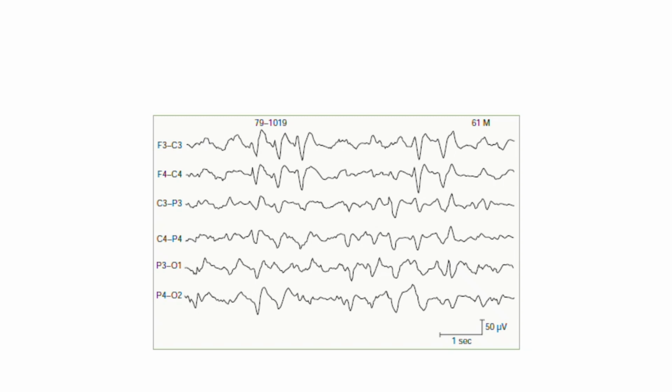3. Pathophysiology. The rhythmicity, synchrony, and front-to-back migration of triphasic waves strongly point to a disruption in thalamocortical circuitry. In the setting of hepatic failure, the accumulation of neurotoxins, most notably ammonia, alters astrocytic function, disrupts glutamate and GABA neurotransmitter pathways, and impairs metabolic support to cortical neurons. This diffuse metabolic stress desynchronizes normal thalamocortical oscillations, causing the characteristic slow, rhythmic, triphasic bursts seen here.